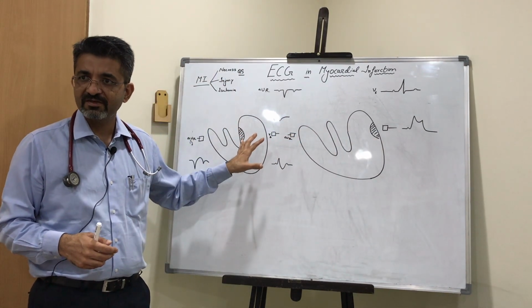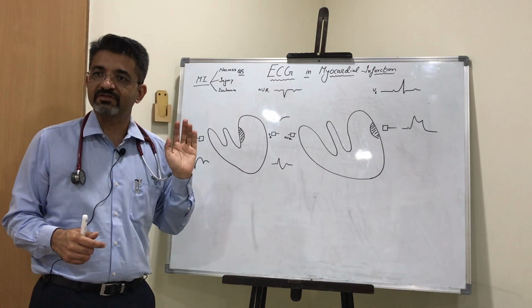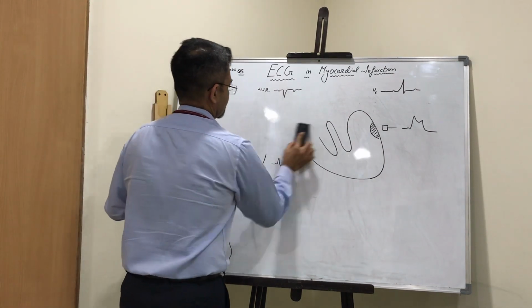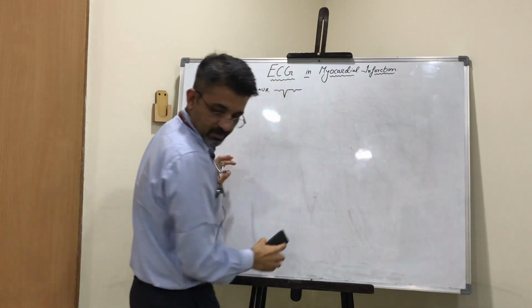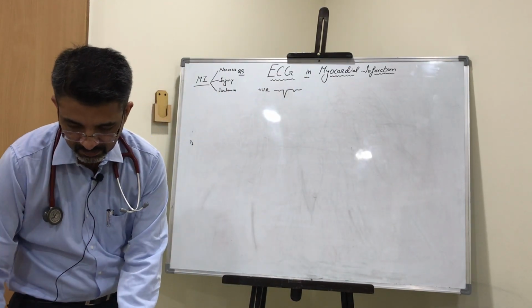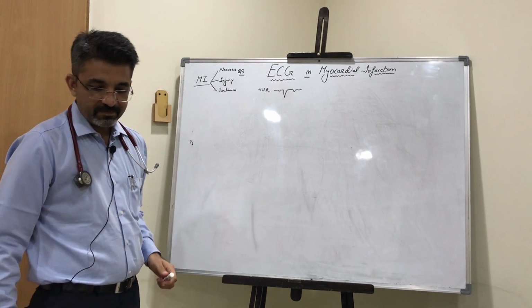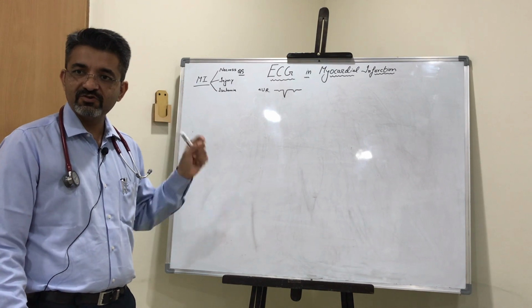Bit difficult, but just understand that ST segment always travels towards the site of injury.